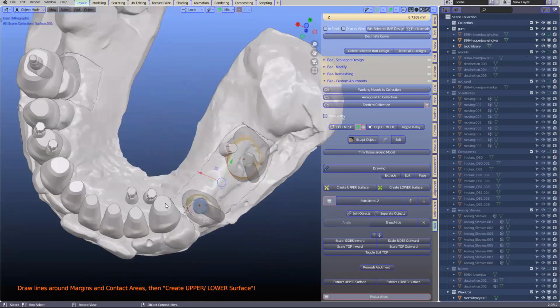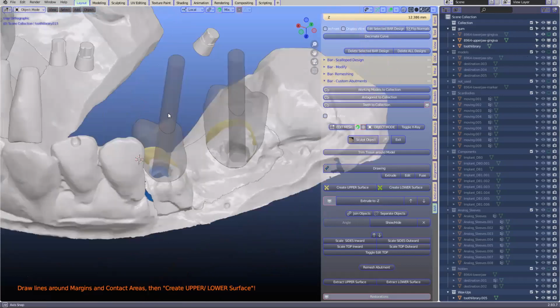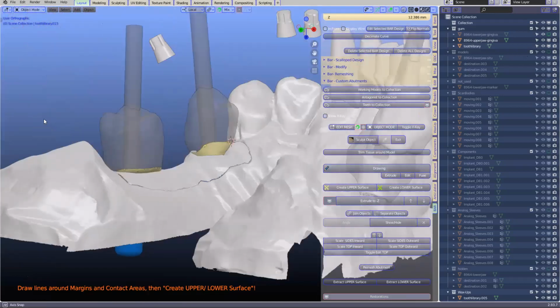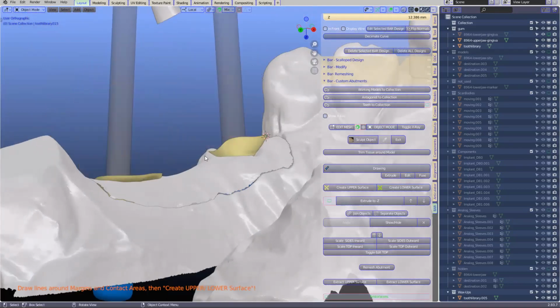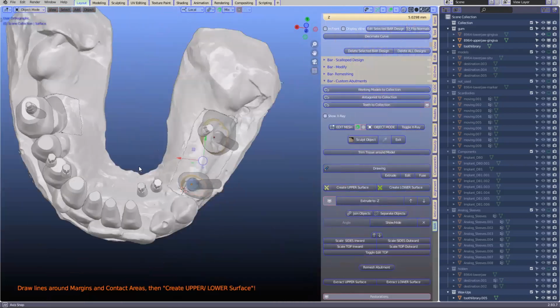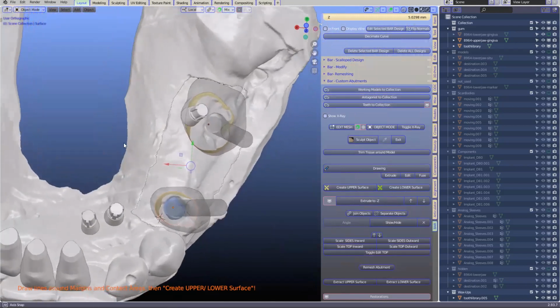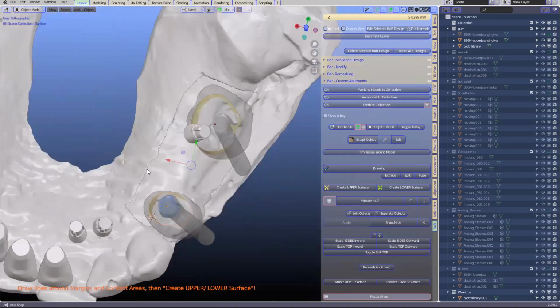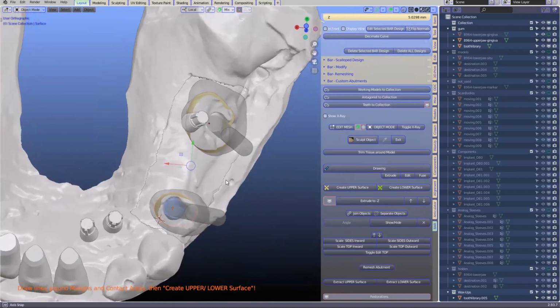Oh, you don't want to extrude it into your tooth. So is it a bit of a survey angle that you're determining here? Yeah. Let's select these again. So we're going to look at it from the top. It's going to extrude towards me. So don't extrude it like that or like that. Have a look at the thickness of the crown. Something probably like that.